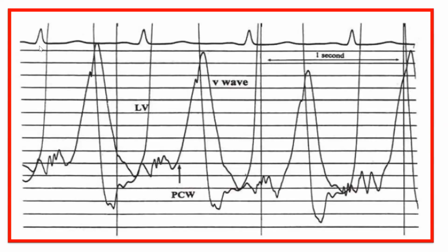Here is another example. We are seeing the left ventricle pressure. Diastolic left ventricle pressure is okay, but late diastolic ventricle pressure is elevated. And we start seeing the pulmonary capillary pressure, which is an indirect measurement of the left atrial pressure. The pulmonary capillary pressure is sky high during systole. What's the cause of the left atrial pressure being elevated during systole? The presence of mitral regurgitation. Also, with this V wave, the differential diagnosis is severe mitral regurgitation or acute severe mitral regurgitation.